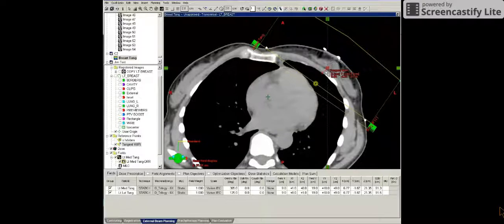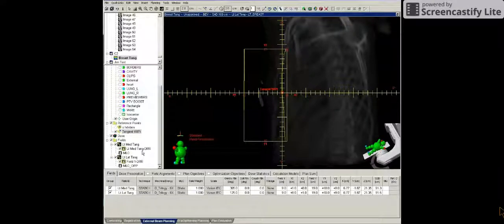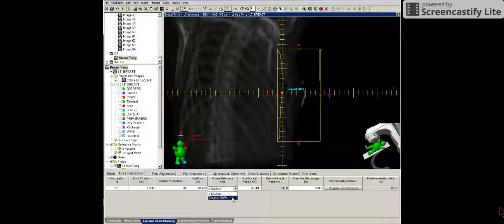And this is essentially where we're going to prescribe dose. So it's parallel with the isocenter and 1 cm from the lung interface. Next, I want to make sure that the tangent weight point is at least 2 cm from the block edge. So I'll look at this both on the medial and the lateral fields. We don't want the weight point to be sitting within the penumbra region, so we need at least 2 cm from the block edge.